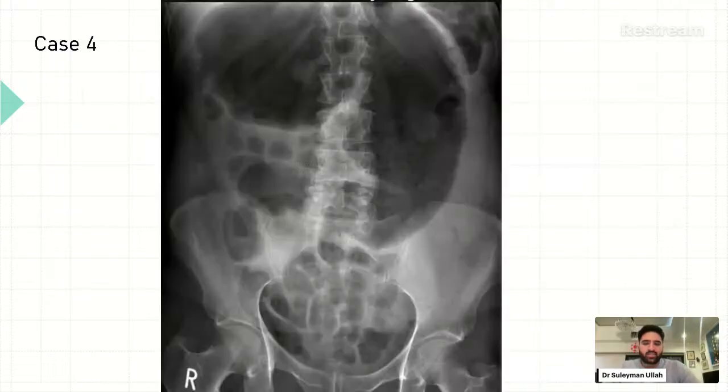Next one, similar presentation. Tell me what you think of this X-ray.